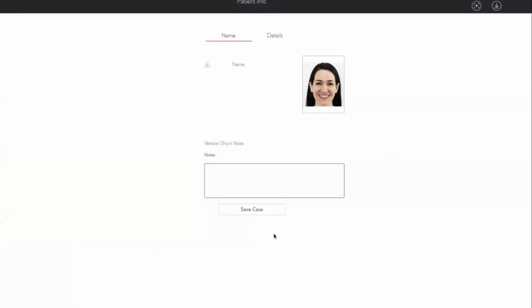We can do the scan, the intraoral scan. We can do the CBCT. We can do the facial scan, whatever files you have. And then we add all these files, the digital records, to the patient documentation, and we create the digital patient.